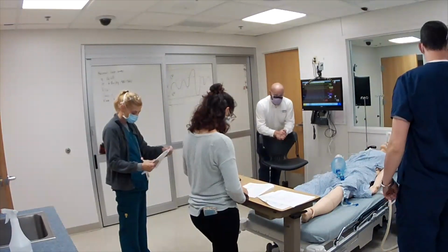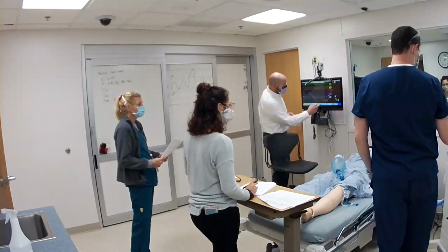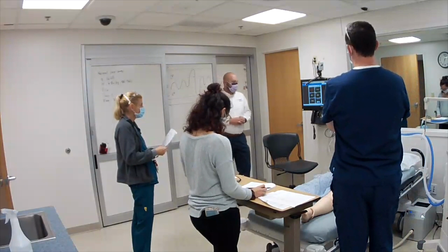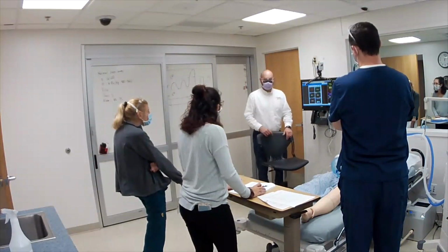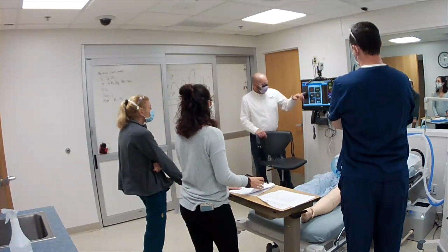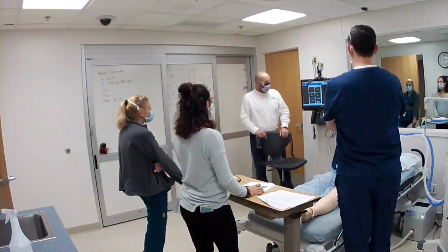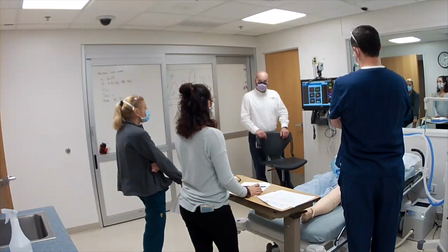All right. Through the magic of science, here's Stanley's ABG in real time. So, what do you notice about what we've given you here? PaO2, PaCO2, and pH. What are these numbers? One's P little a, one's P big A. What's the difference there? One's alveolar. Alveolar, yeah. So big A is alveolar. So we have arterial and alveolar gas. Absolutely. So we can calculate that.